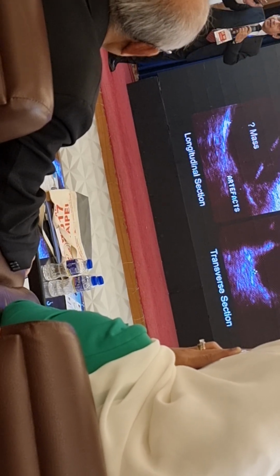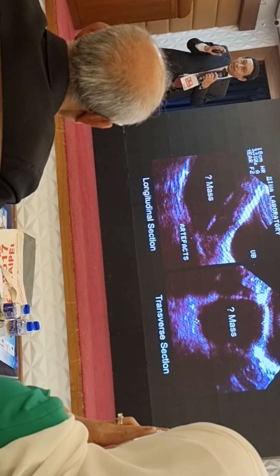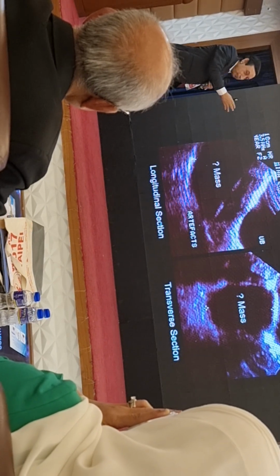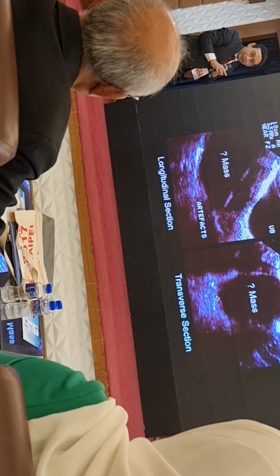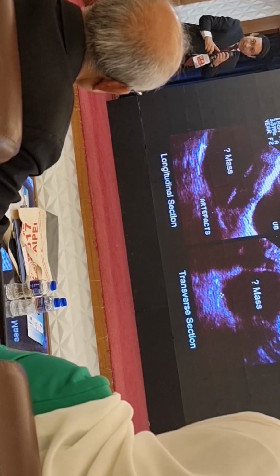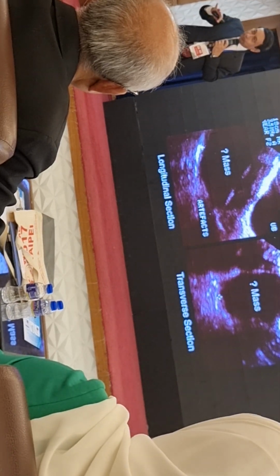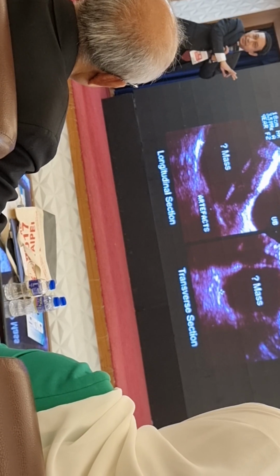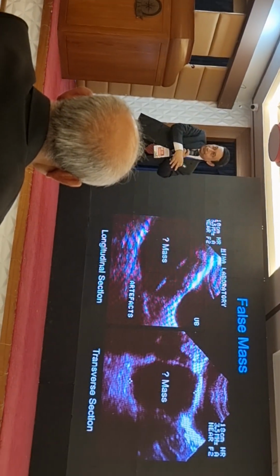First of all, a high grade of suspicion. Yes, there may be some problem. That is a high grade of suspicion. Then, we can change the environment. How can we change it? Either we can ask the patient to drink some more water so the bladder is more full, and scan again. So the environment is changed. Or we can ask the patient to go to the toilet, urinate, and then come back.